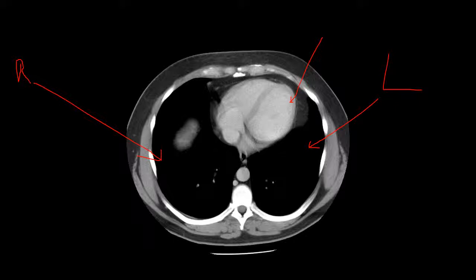And how do I know that? If you look at the heart, you can actually see the chambers defined pretty well, and they're nice and bright white, and that's because there's IV contrast in there. IV, intravenous, is going to go through the circulatory system, so everything vascular should light up. So that heart's really nice bright white.